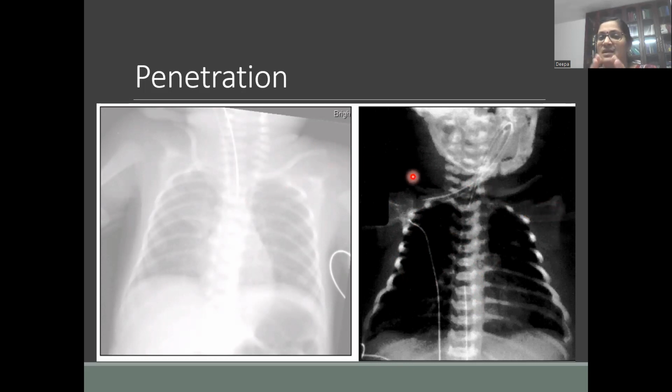So that is regarding the quality of the X-ray. Interpretation starts with assessing the quality of the X-ray. You assess the quality of the X-ray with respect to rotation, with respect to what phase of breathing the X-ray was taken. It is a good idea to get it in the inspiratory phase. And third would be to assess the penetration of the X-ray.